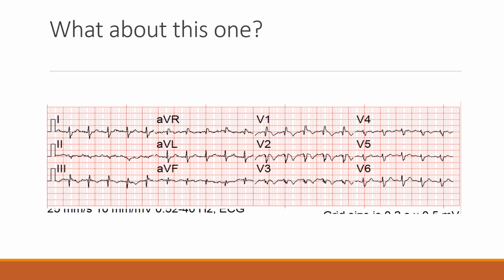And then you also have, and this one's a little less sensitive, although the textbooks love this one more, an S wave in lead 1, a Q wave in lead 3, and a T wave inversion in lead 3, which is called an S1 Q3 T3 pattern. And so this prompted the crew to pause and to do an ultrasound of the patient.